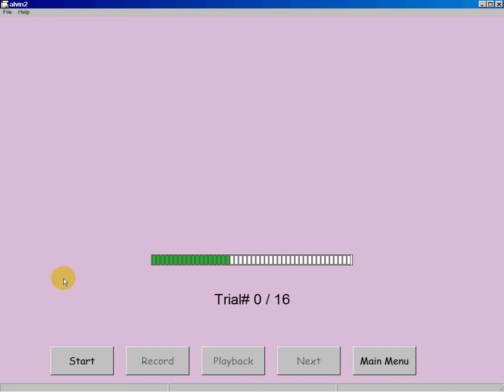Now the monitor of the sound level meter has green, yellow, and red, as you can see as I get louder. The red area is the area where you should probably try to avoid because you're going to cause saturation or clipping of the signal and distortion. As long as you have occasional peaks into the yellow or the red, then your levels should be okay.